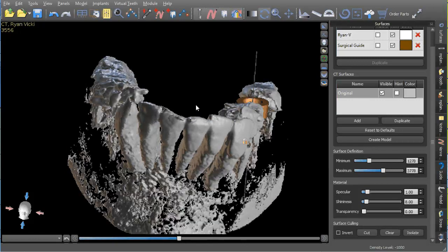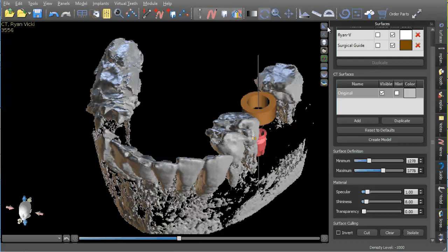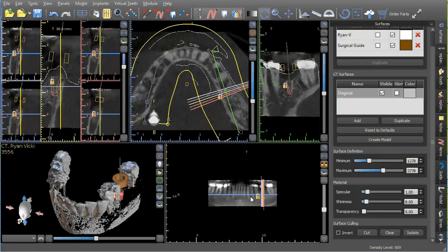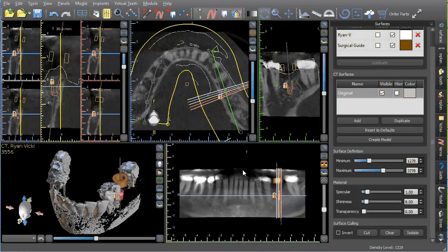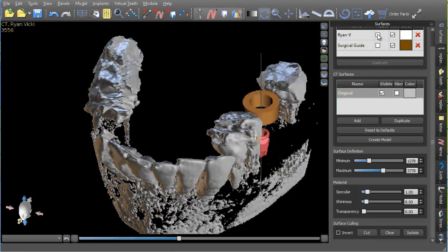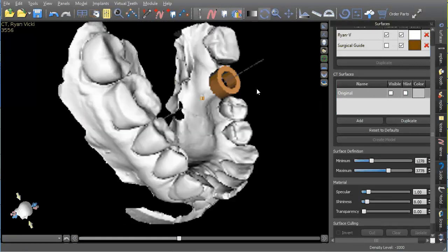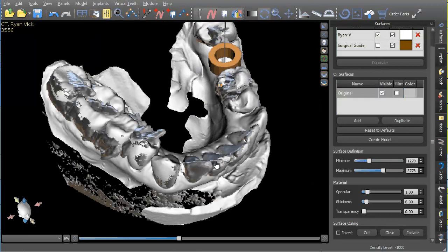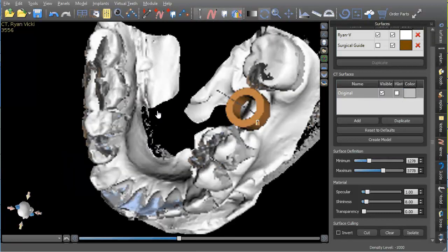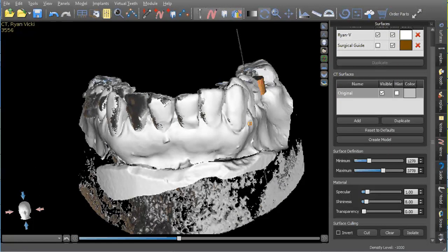And remember, this view right here is pretty relevant. We don't care about what that looks like because no matter what cutting you do, it doesn't actually affect the radiographic images. So, for instance, if I get it all lined up and here is the overlay, from there on out, I still got everything. I'm not losing data as far as seeing the model and how the teeth relate to where the implant's going to be. So. All right. Hope that helps someone else out.